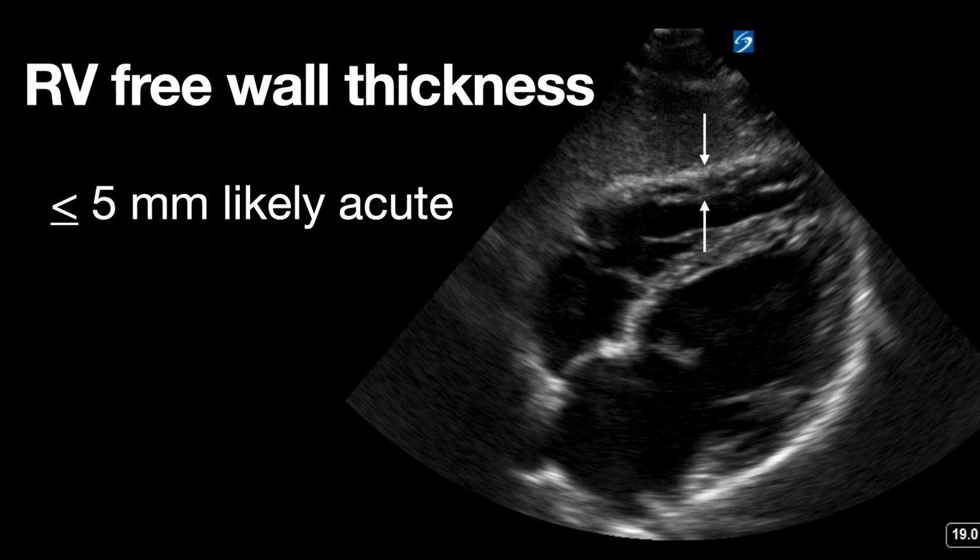For RV free wall thickness, measured in the subcostal long axis view at end diastole, if the RV wall is less than 5 millimeters with RV dilation, it is likely an acute process like acute PE. But if RV free wall thickness is more than 5 millimeters, then it's more of a chronic process, for example chronic pulmonary hypertension, or it could also be acute PE on top of chronic disease.